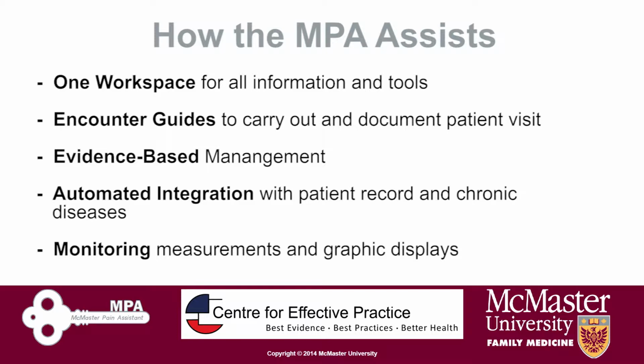The MPA provides one workspace where all of the patient information relevant to pain care is at your fingertips. Encounter guides suggest evidence-based management. They offer resources for providers and patients and can become your progress notes and referral letters. Parameters that are assessed for other chronic diseases are automatically drawn into the MPA tools. All numeric measurements are displayed in a tracker list, as well as graphically.